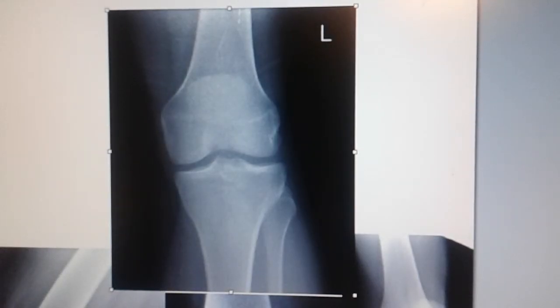Okay, so I have borrowed some images off of Google Images that I will throw away when I'm done. We're looking at an AP knee. To make sure that it's a good image, I need to move my head away from the camera. The femoral tibial joint space should be open. The knee needs to be extended.